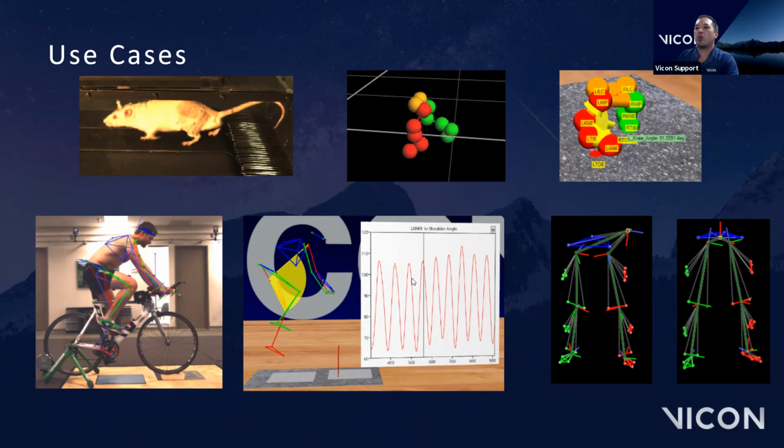So I think what most people think is that ProCalc is kind of a research tool, used mainly to develop these models, et cetera. But what hopefully you can get out of this as well is that it's a great teaching tool as well. It's a great opportunity to show students or potentially people that are just new to modeling or new to biomechanics and just say, hey, this is how we can go ahead and create some vectors.